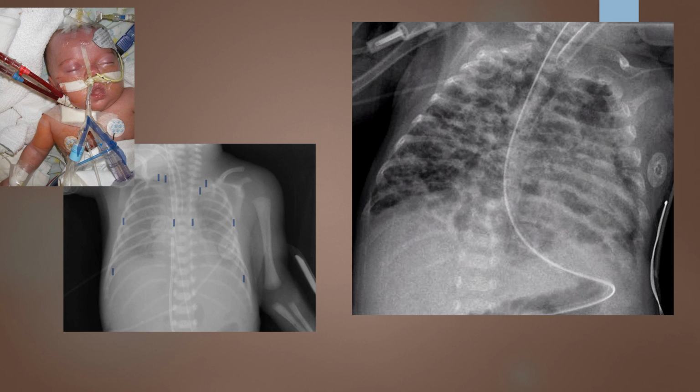You also see that the baby's head is turned. That's probably contributing to more of this rotation. So by straightening out the baby's head, it might correct the problem. So if we look at mid-coronal tilt, we would see that the anterior and the posterior ribs are superimposing.